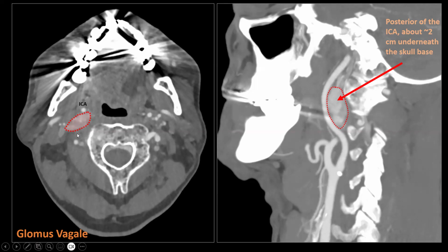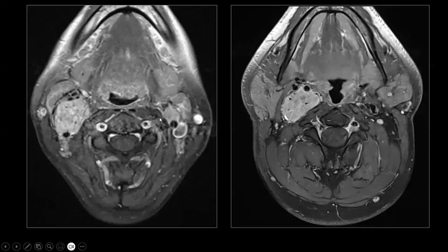So it's not located behind the tumor as in carotid body tumors, but it is pushed anteriorly. Here we find some branches of the external carotid artery, and here we have the internal jugular vein. So the internal carotid artery and the internal jugular vein are now displaced from one another, while in a carotid body tumor, they are still located next to each other.